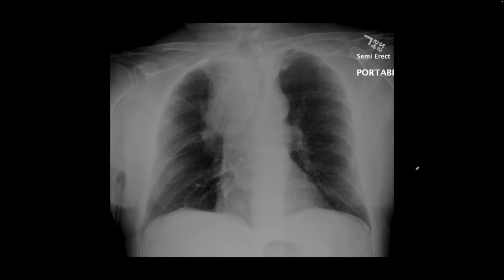Here is a chest x-ray, and in the next slide, I'll show you a correlative CT scan. How would you describe these findings? So the aortic knuckle looks okay, cardiac silhouette here is fine, left heart border, the right heart border, the lung fields are clear. But in the right paratracheal space, there is soft tissue fullness. And so also there is tracheal deviation towards the other side. So when you see such findings, think of a mass and ask for a CT.